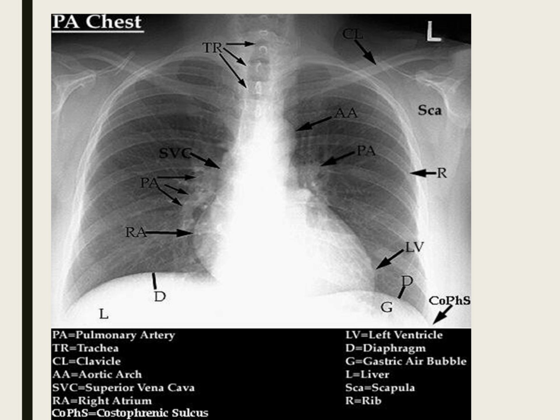As I mentioned before, in X-ray it's really the changes in contrast from tissue to air. So if you start obscuring the sharp edge of the diaphragm, something's going on. You can have pneumonia, consolidations, a pleural effusion, right? Also look well under the diaphragms: air under the diaphragms is bad. If somebody has an abdominal process of some sort, like a perforation, you're going to see air there.